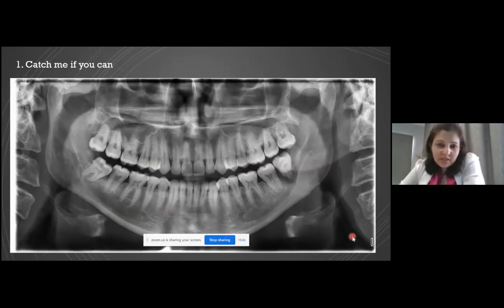So when you're looking at it, look at it from the top right corner to the bottom left corner. Remember the grid that I had told you, 1 to 9. And tell me what you're seeing. Okay, so this is number one.